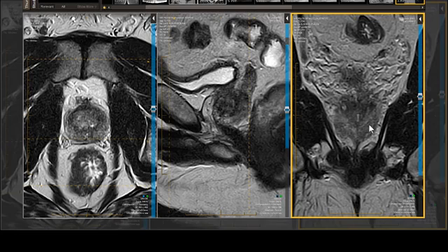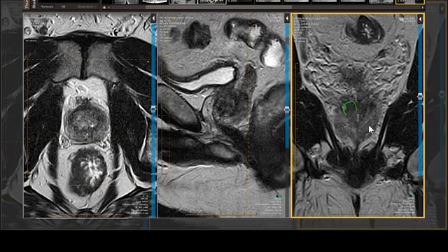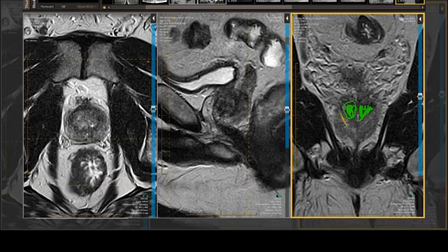of the prostate. So let's draw over with my favorite central zone color, green, the central zone on the right, the central zone on the left. This is probably a little more central zone right here. This is probably some volume averaging right here. And then let's color in the transitional zone. Let's make that kind of a lighter orange.